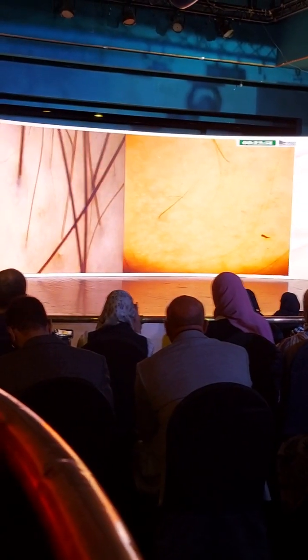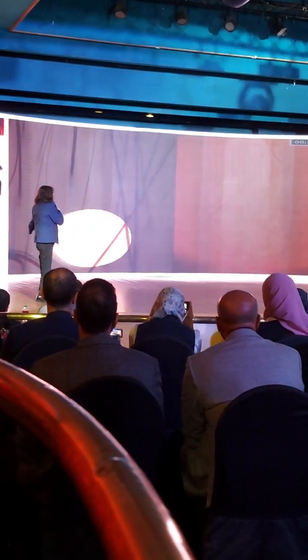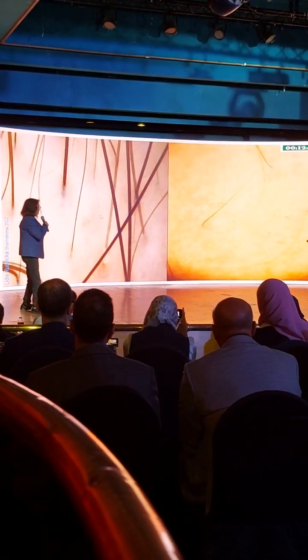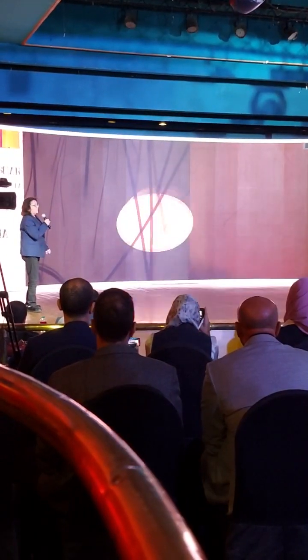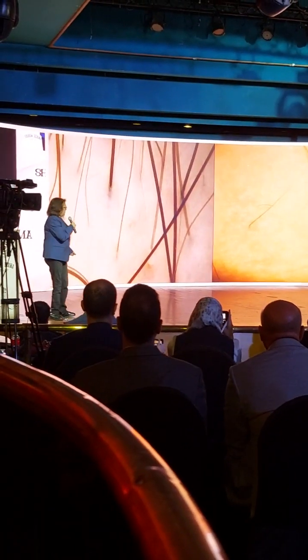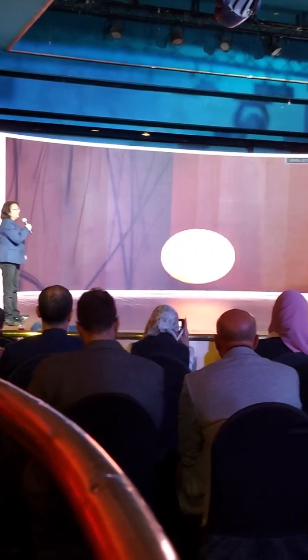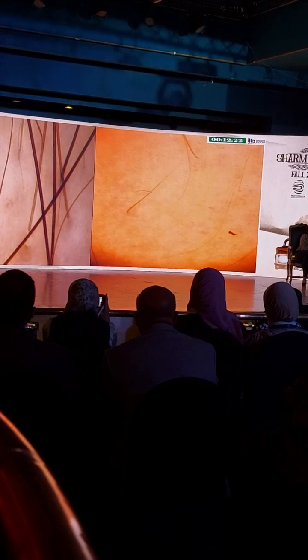The main feature of androgenic alopecia is hair shaft thickness heterogeneity, as in this image, and this is the image of the man whom you have seen in the previous image. And here, a very late onset androgenic alopecia, which may make the impression of a cicatricial alopecia. Maybe you can also see some white dots. So we may think that this is lichen planopilaris or a later version of lichen planopilaris, so we should not be surprised with this image.